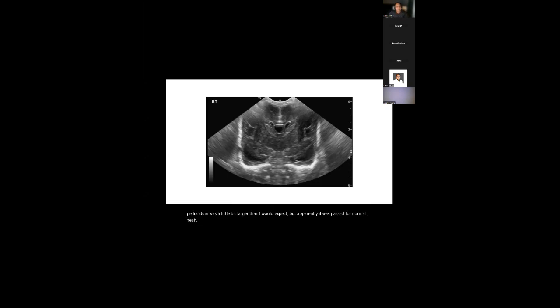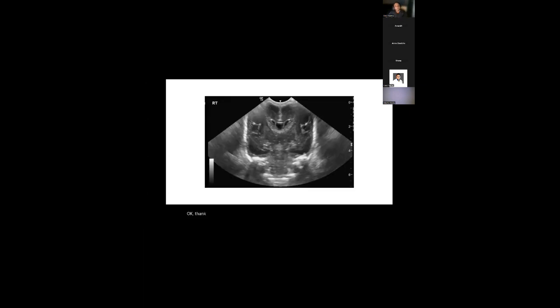Just to be aware that obviously if your baby has cerebral edema, then the ventricles might be a little bit smaller. But in this case, you've got nice white Sylvian fissures. Ventricles look good. Just a little bit bright inferior to the ventricles. It'll be interesting to see what we see in the sagittal views. But it's a brilliant image. Can I just say, your depth and capture of the anatomy is brilliant. Thank you. And then again, the ventricles, septum cavum pellucidum, Sylvian fissure.